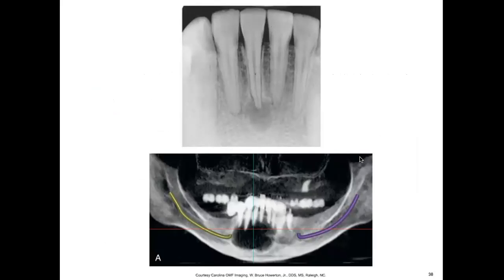In this top image, we can see the lower anterior tooth. We can clearly see an apical radiolucency around the tooth. Here is a more exaggerated example of this. This is a huge, gigantic cyst on the mandible of the teeth. It can sometimes be mistaken for a tumor. And just from looking at the radiograph alone, it's not enough to diagnose whether or not it is a tumor. Something like this should be sent to an oral surgeon to be evaluated by some type of biopsy.